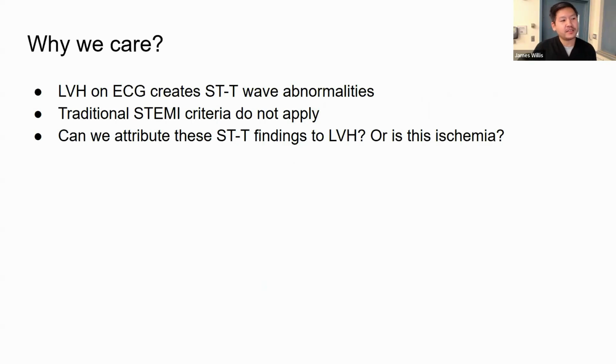So why do we care? Like I said, LVH causes ST wave abnormalities. It can fulfill STEMI criteria, which is kind of annoying. And you have to ask yourself, can you attribute these ST findings to LVH, or is this ischemia?